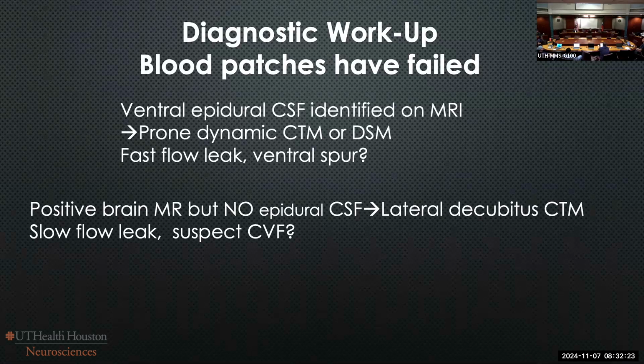So the MR myelogram is negative. If it's negative, then what you're suspecting with a positive brain MRI and classic symptoms is that there's a CSF venous fistula. And so that's when you do the decubitus. You want to fill there. 85% of those are associated with meningeal diverticula.